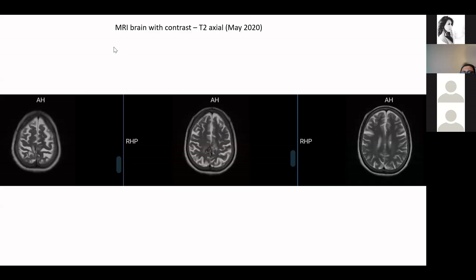So there are some T2 hemosiderin blood-related products secondary to post-surgical changes on the T2 weighted images, which we can appreciate in the middle image. And there seems to be some associated solid component as well. But for that, I would like to look at the post-contrast images.